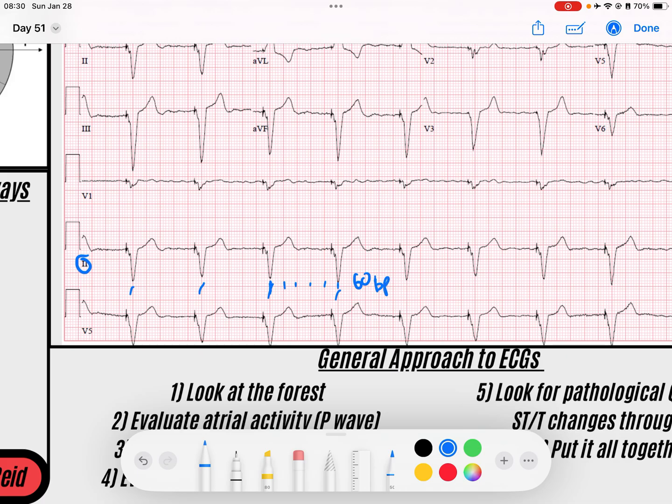And when I look throughout, I notice that all of these QRSs are landing right on that solid line. So 60 beats per minute is occurring very regularly. There is no deviation. That's pretty difficult to see. Usually there are some small variations as our vagal tone increases and decreases with respiration. And what you'll find is why this is occurring: if you look in front of the QRSs, you start to see these little deflections, and these are pacing spikes. So just by looking at this, when we look at the forest part of our ECG, we see we've got these pacing spikes.